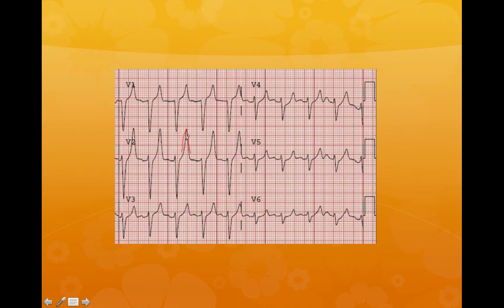What would the units be for that? Would it be 6 milliequivalents, I believe? So above 6 milliequivalents, you would tend to start seeing this abnormality. Not always on the ECG, because a lot of the ECG changes occur due to changes in electrolyte concentration, not just the absolute concentration itself. But here we see the tented or peaked T waves.